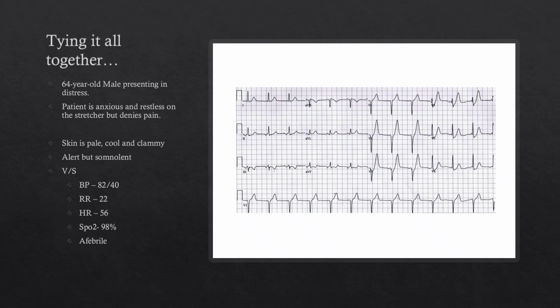And so when we look over the ECG, prior to taking it, this is a patient that you would have expected to see either VTAC or a massive STEMI, and you look over and you see this pattern here. So when we look, hopefully your eyes go to right here, we see these tall, symmetric T waves, and then the concurrent ST depression. And so what do we think about that?